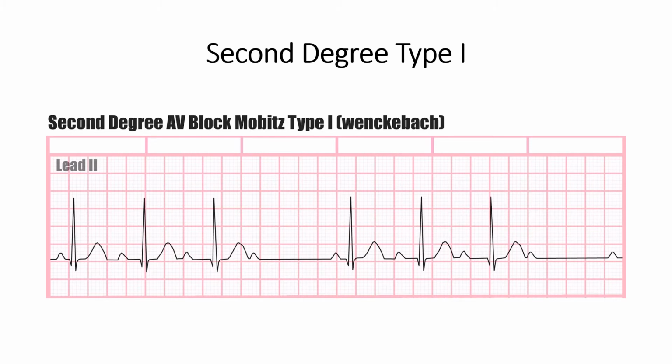First thing you should ask yourself is, do we have drops? Drops or no drops? For some of you, you may have already identified the drops, but just like we taught in the first part of this lesson, it's to be determined by the R to R. Excuse my pen, it won't go all the way. And then look at this one. I hope you guys have identified at least one drop by now. Okay, looking pretty good there.